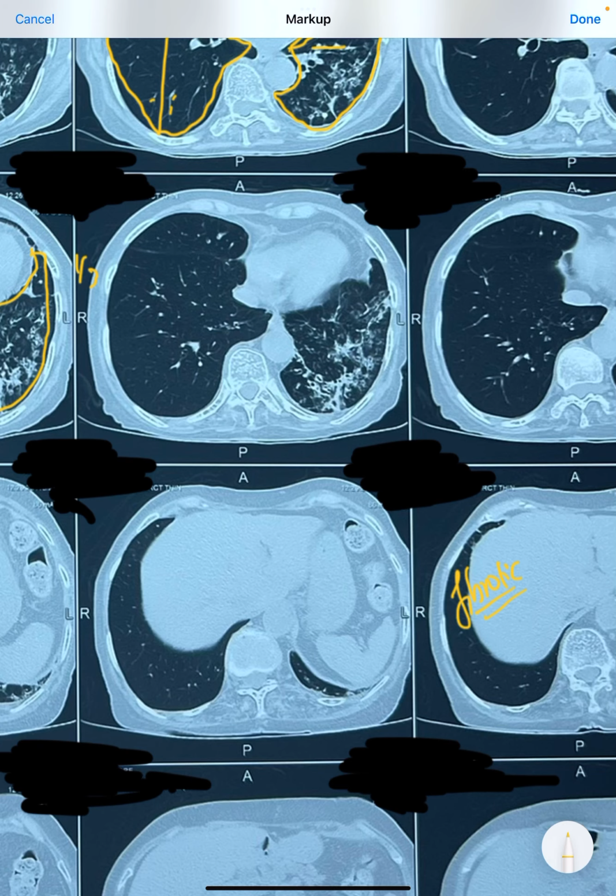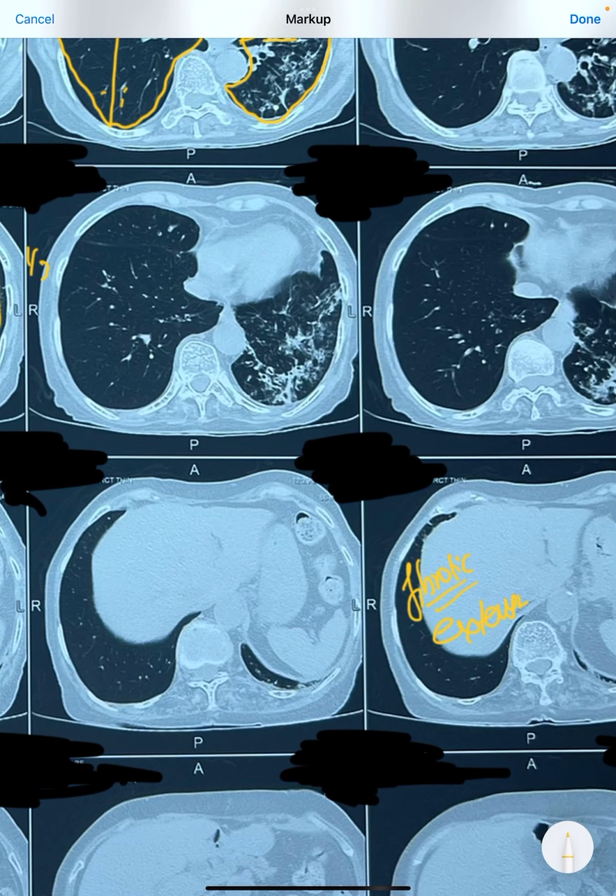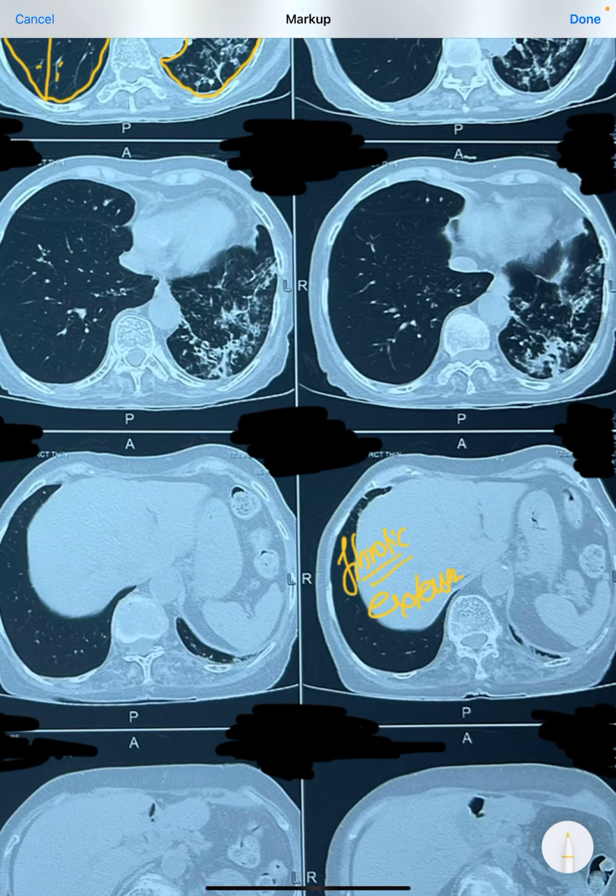But in some instances, because of extensive damage or very aggressive bad bacteria which is resistant to treatment, the repetitive lung damage will lead to fibrosis and it will not resolve. So fibrosis will cause irreversible formation of streaks of fibrotic bands, which will actually shrink the lung parenchyma.